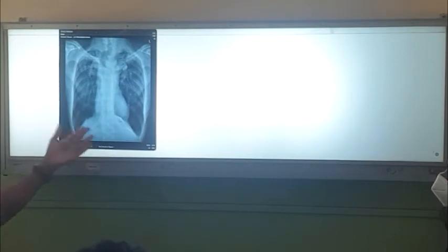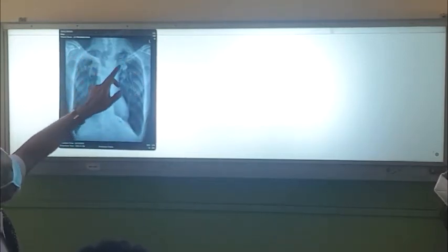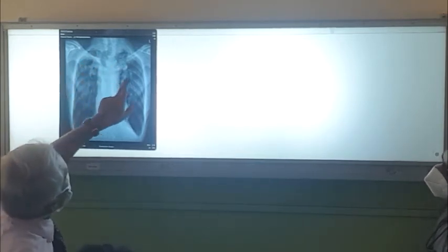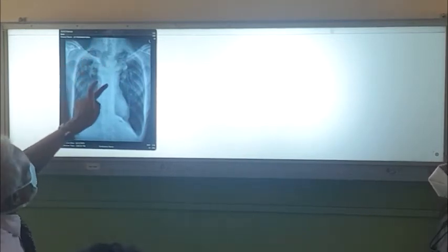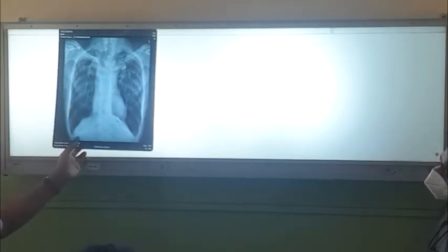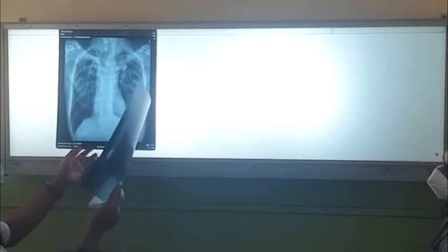These are all TB patients with emphysematous lower zones and a fibrous upper lobe, right? And these vessels should be here. It has gone up to this level, and this one should be here. It is also going up. And this is the trachea. See the contour of the trachea. And all this happens because TB causes fibrosis and fibrous tissue contraction, which pulls on the lung tissue here, and this area has become emphysematous.